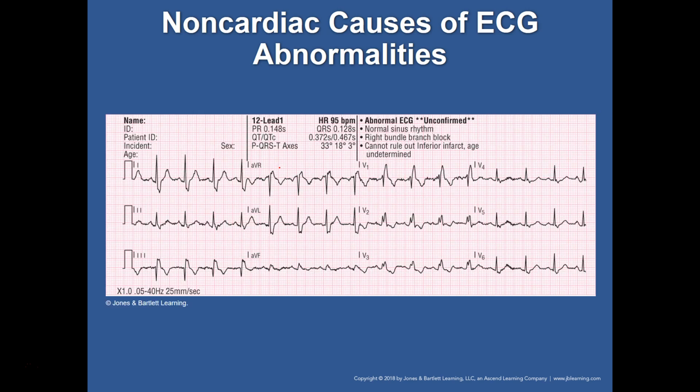So let's take a look at this. We are talking about lead 1, right? We see that we have a deep S wave. We see a deep narrow Q wave in lead 3. A deep Q wave here.